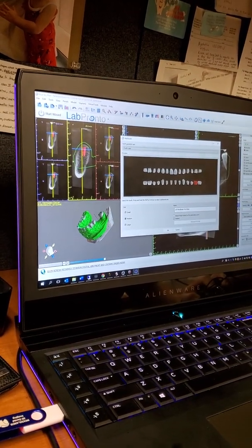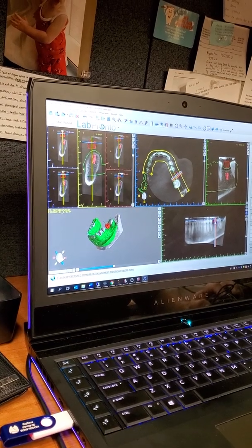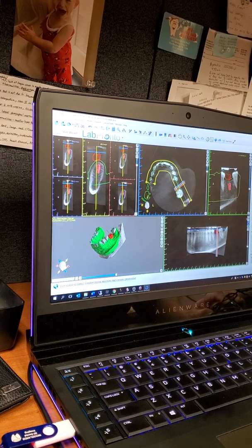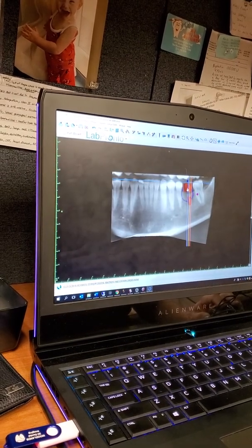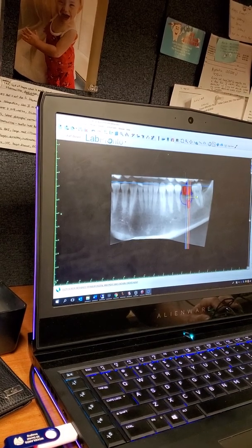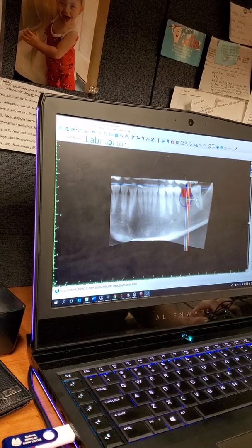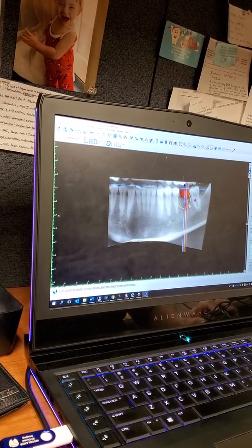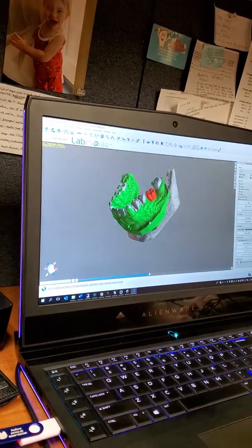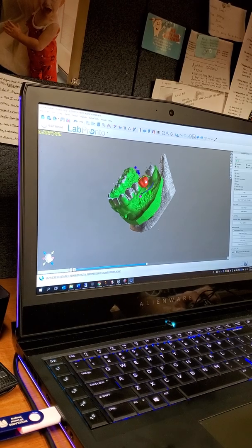I'm going to pick a medium size left mandibular molar, click OK, and I drop it again on the panel. You don't have to drop it on the panel. But one of the things that you can do, blow it up, you'll see there's 2 little dots. One of these, if you look, makes it bigger. So you can size it up, make it wider than it was initially. Scroll back out, and what's important is the STL model, this one. So if it looks like it lines up here, it's actually going to be correct.